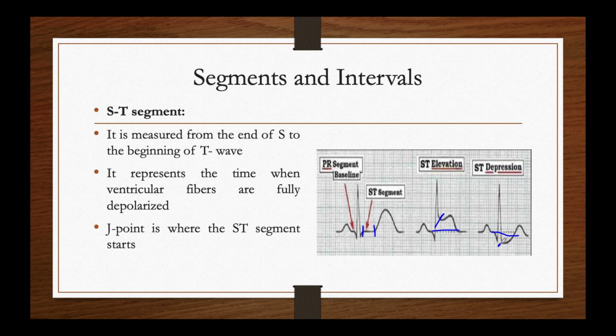Now when we talk about segments and intervals, an important thing we must know is that in intervals we describe the duration of time. And so the problems cannot be with the morphology, depression or elevation of the waves, as we see in segments. Intervals only talk about the duration, and so intervals may be prolonged or intervals may be shortened.